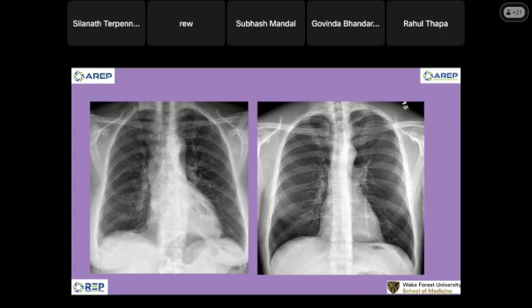Okay, let's finish this up. So what is the difference from the left? All right, let's come back here. This is the mediastinal mass. The mediastinal mass is pushing the aorta to the left. If you look at it again, the left border of the lung, this is the aorta that is pushing to the left. Are you talking about this?